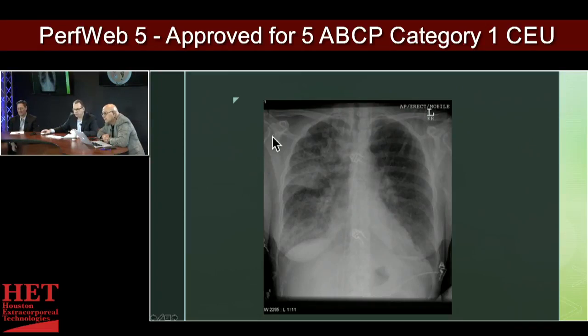You see it preferentially in the upper lobe, which is that defect you're talking about here. And then you have this diffuse process where your gastric aspirate causes an inflammation of the lung parenchyma. So this would be something along the lines of an aspiration pneumonitis, pneumonia. See, you got it. You just talk about it. Just describe what you see, and the answer will come forth.